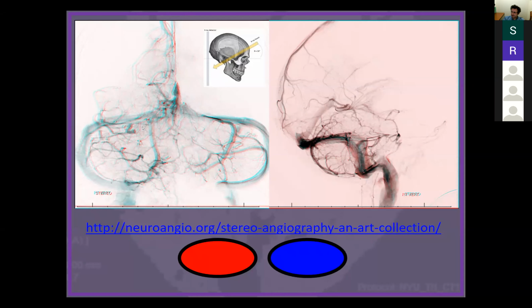And they do it more often than not. These veins don't directly join, in this case, the transverse sinus, right? They go into this structure. You see how there's this funny flat line here. This is not so apparent here, but this is a good example in this individual. There's this little line, right? That line is a tentorial sinus. So these veins don't directly drain into the transverse sinus.